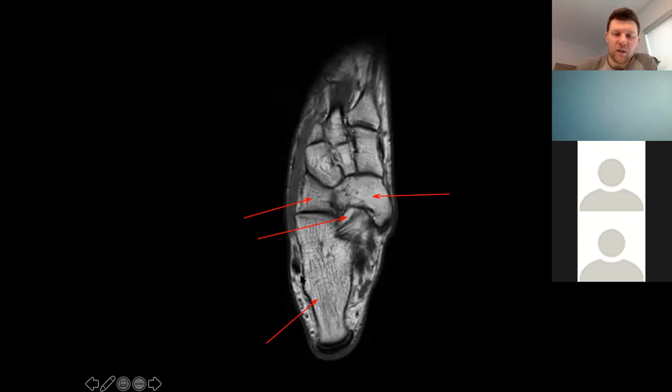and go around the lateral mal, which one of these tendons is going to be more posterior of the peroneals? It should be your longus, shouldn't it? Yeah, so this bigger one's the longus, because where's that going to dive? Underneath the cuboid. Yep, exactly. And then your brevis is going to be more distal and go right to the met base.